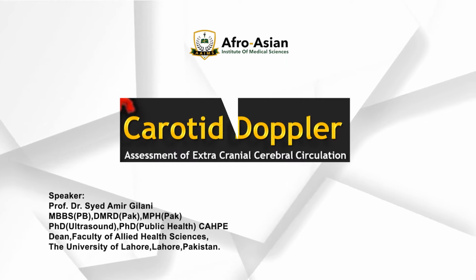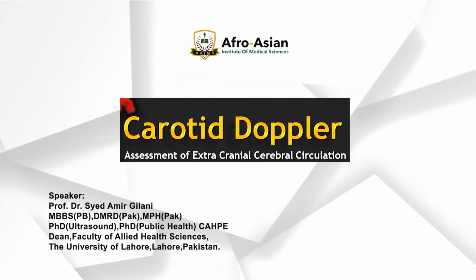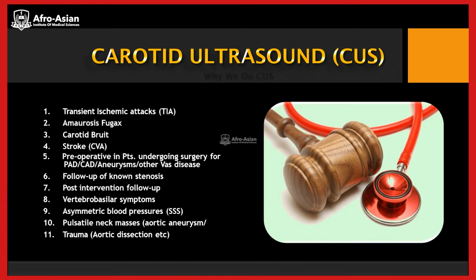Carotid Doppler assessment of extracranial cerebral circulation. The carotid ultrasound is performed when we have one of these 11 indications, which includes transient ischemic attack, amaurosis fugax, carotid bruit, stroke, preoperative in patients undergoing surgery for PAD, CAD, aneurysms, other vascular diseases.